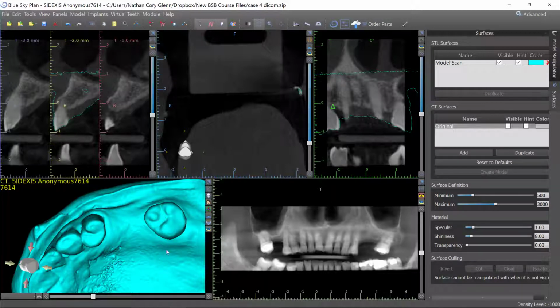So I've done this planning already. There's no way actually in the bone available that two implants can fit. And so unless you were to orthodontically move this tooth, that's not going to be an option. So what was opted for in this case was to crown both teeth since they were pretty beat up, reshape this, and then be able to put one implant in the center that's going to be appropriately sized when the other crowns are done.